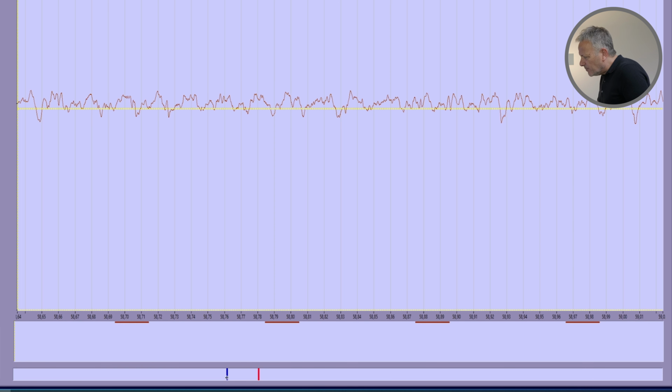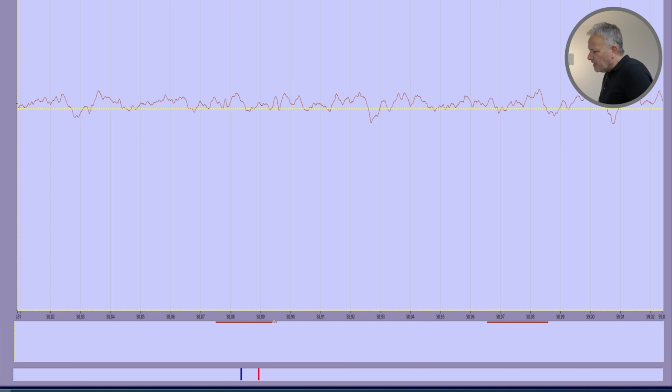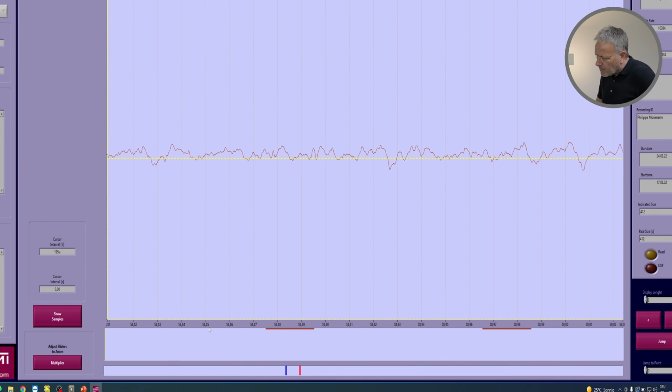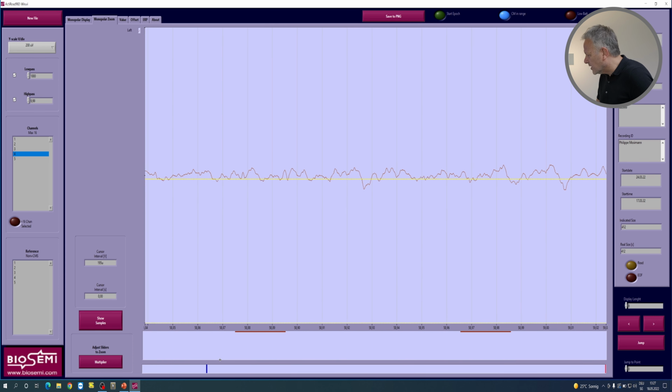So let's pull a little bit more until these get really big. If they're not big enough, we can multiply again, and we get the full gain again to pull in and stretch. So we can really stretch and make them really, really big. Okay? What we can also do, this is a beautiful little feature, is actually show each sample.